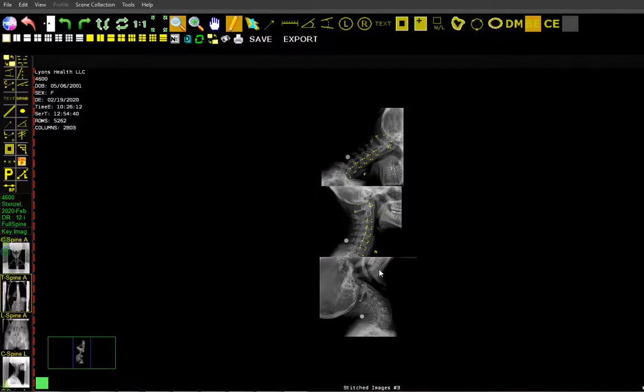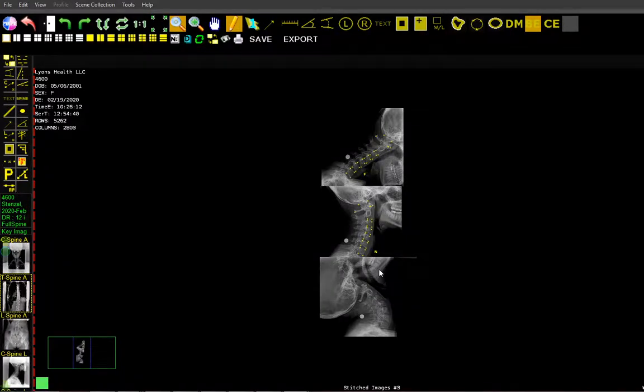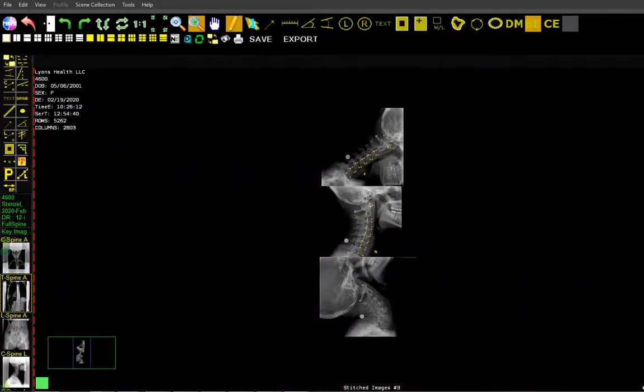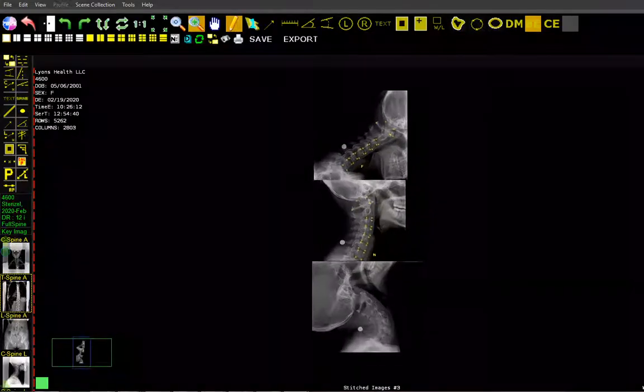One of the more difficult aspects of managing flexion extension injuries is quantifying it. If you can't measure something, you can't really accurately manage it. And so what this has done is taken all of the legwork out of that. It will measure and quantify all the ranges of motion between all the cervical vertebrae and compare them not only to flexion to extension, or it does flexion to neutral and then neutral to extension and then the overall total, but it also will compare it to the normals.